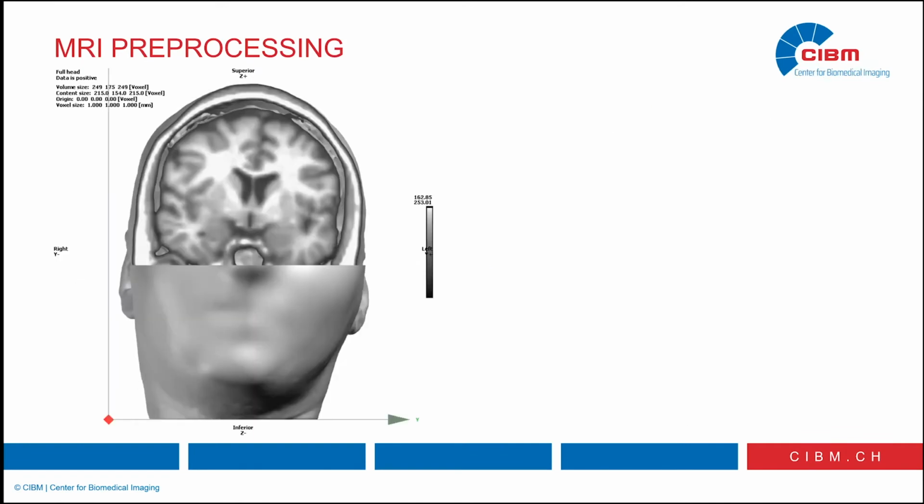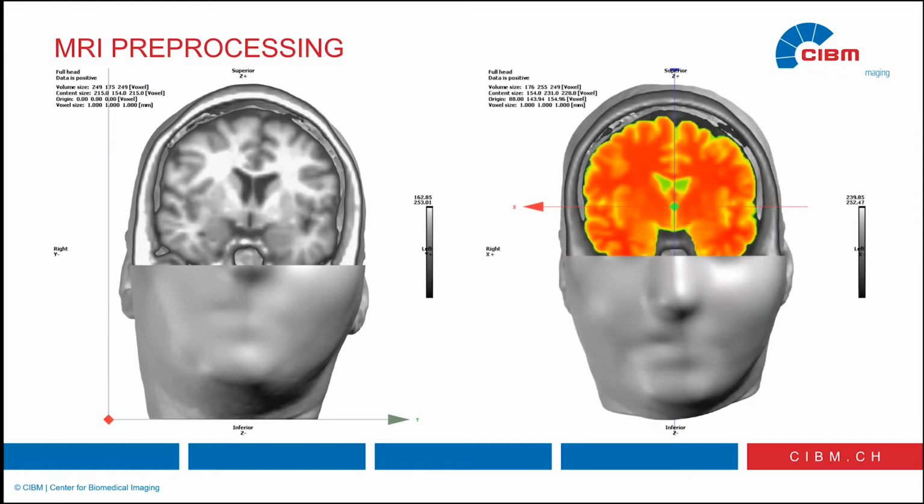Another real-life example, which is, as I say, a patient who certainly was operated, and on the MRI, the head was tilted. That's what we want at the end. And more precisely, if we can bring some focus right here, the mid-sagittal plane, so the cutting plane here in the middle, has to go through the brain. It's not going through the face or the head itself. What we want is to cut into the left and the right part of the brain, which it did actually. It did nicely, but we can see that the brain is not symmetrical between the right and the left.